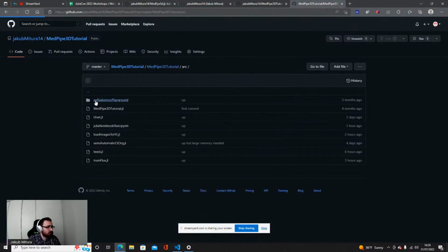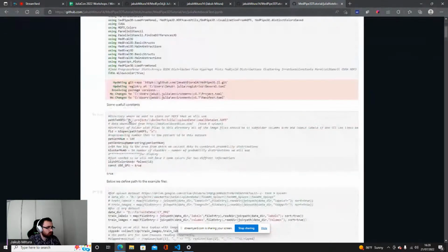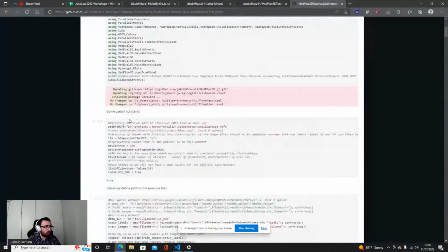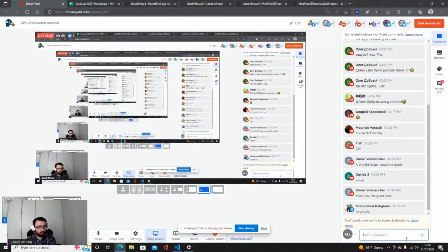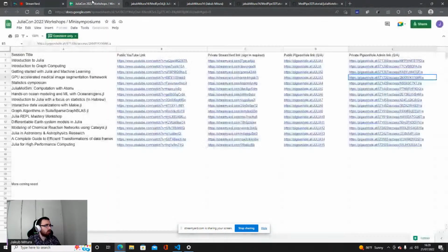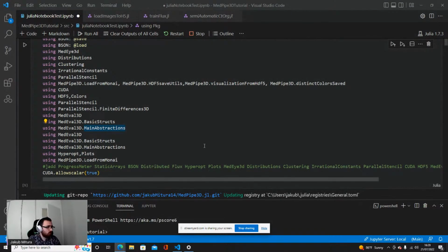And in the source directory, we have this Julia notebook. And here we have the notebook that we'll work on. So I'm just sharing the link one more time for everybody to have it. Okay. And we are here.